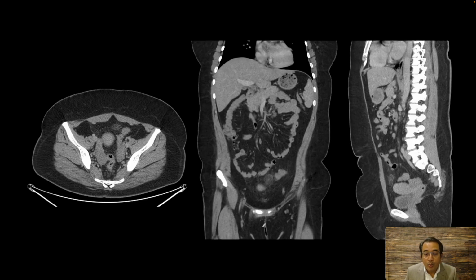This is our next patient who presented with left lower quadrant abdominal pain, and diverticulitis is a common cause of this abnormality, but in this patient we see fat stranding which is loculated abutting the colon with a central linear density which is the thrombosed vein, and all of these findings are characteristic of epiploic appendagitis, not to be confused with diverticulitis.